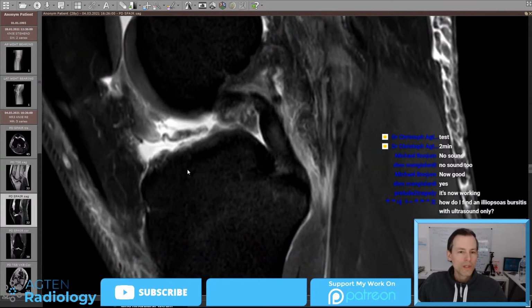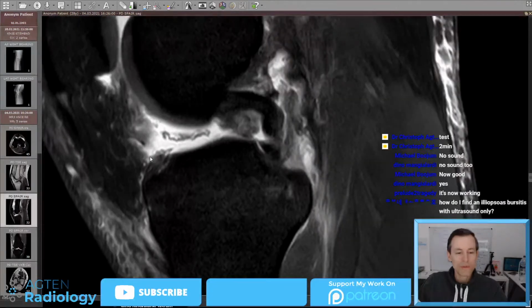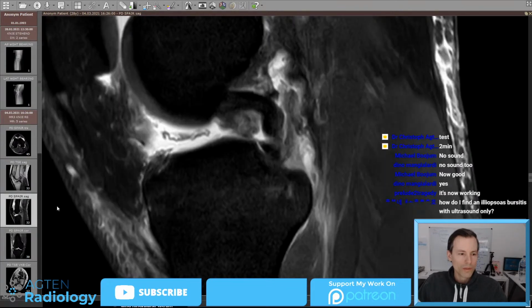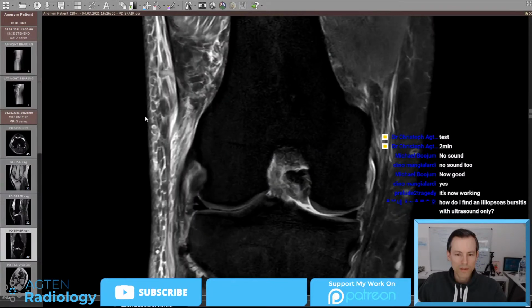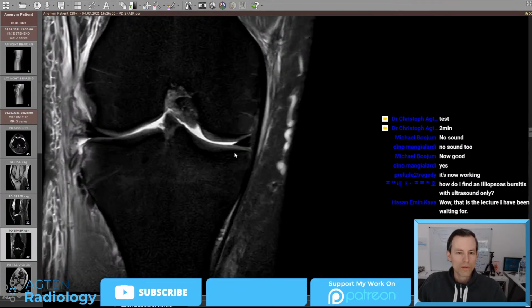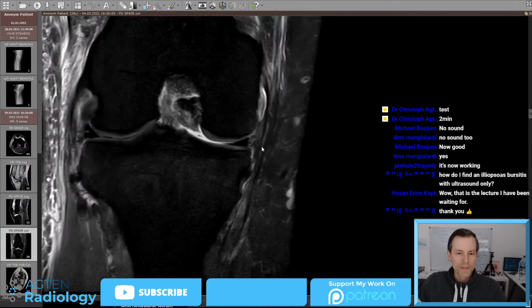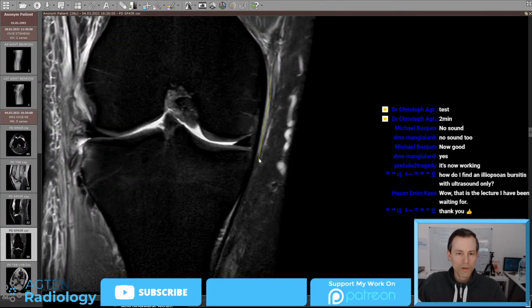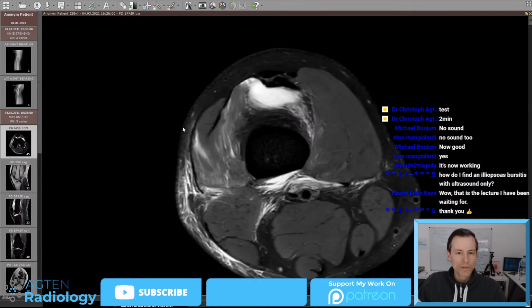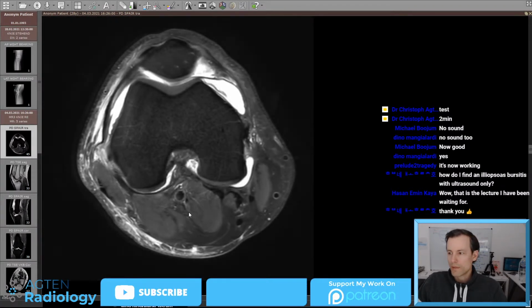Now, moving on here with this case. So we had covered the meniscus. Basically, we just ended up here with this injured anterior root as well. And now we can also have a look whether the position of the meniscus on the coronal is somewhat altered, but it's not, so it's quite nice here. And then we can immediately see the MCL. It has some soft tissue edema all along the ligament, but the ligament itself is okay. We can also use the transverse here. So maybe I need to make this a bit brighter.